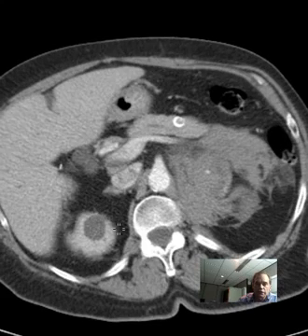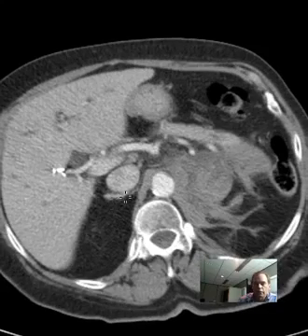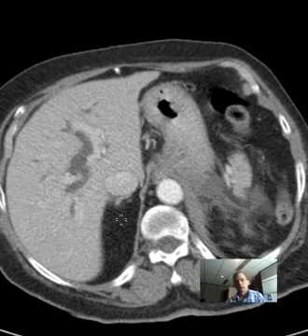We have a little renal cyst there, or I'm sorry, on the right side, and here is the right adrenal gland. Now normally there's not a whole lot to see, and that's why if you want to pick up an adrenal abnormality, you always have to look for it.